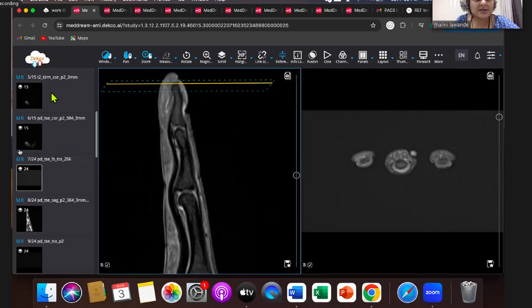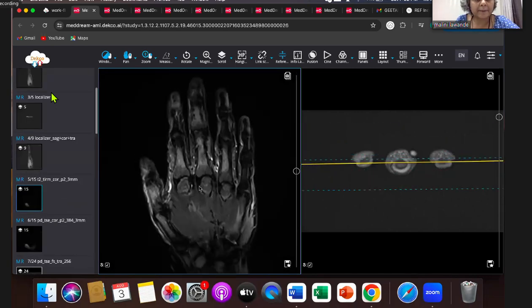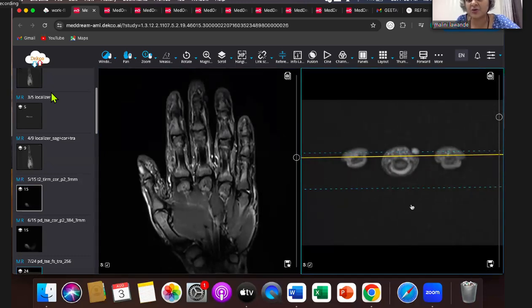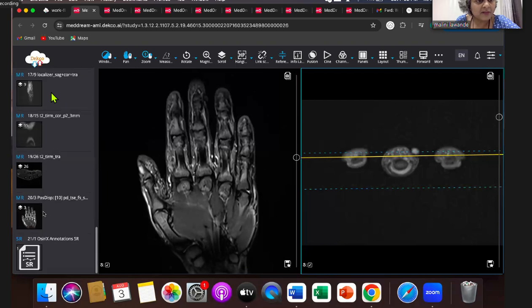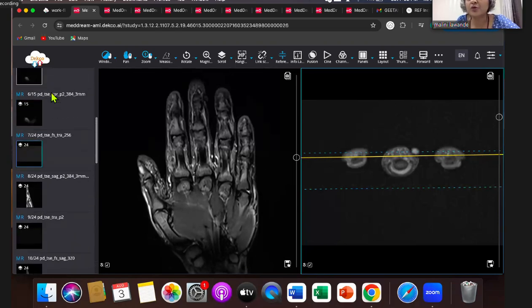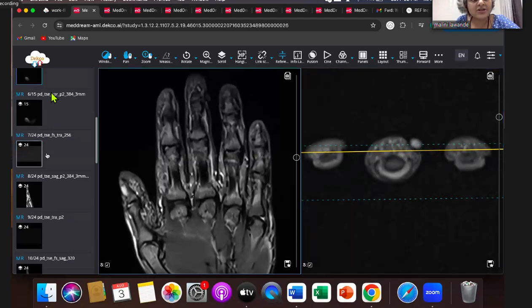So this is ideally a place where I do not want to put a pain marker, but here a pain marker has been put and luckily the lesion has not been squashed. So the important thing is to look very carefully. I don't know if we have given contrast. This is not the best case to show it, but the reason I wanted to show you is the location. So when you look very carefully, you have this small lesion here.